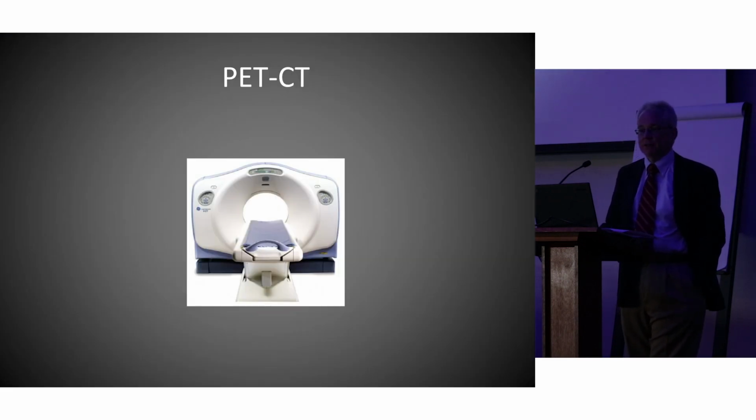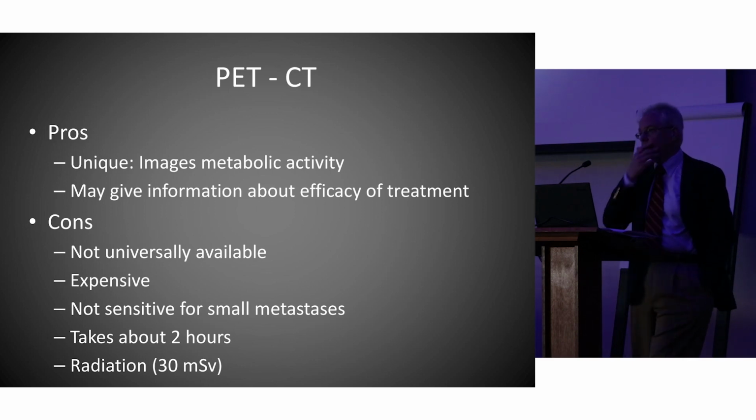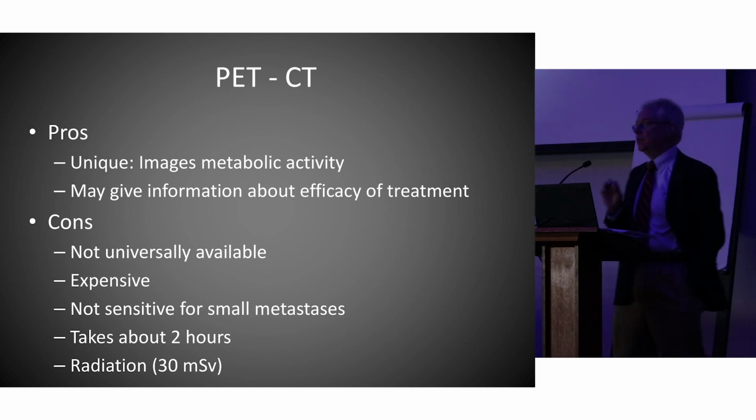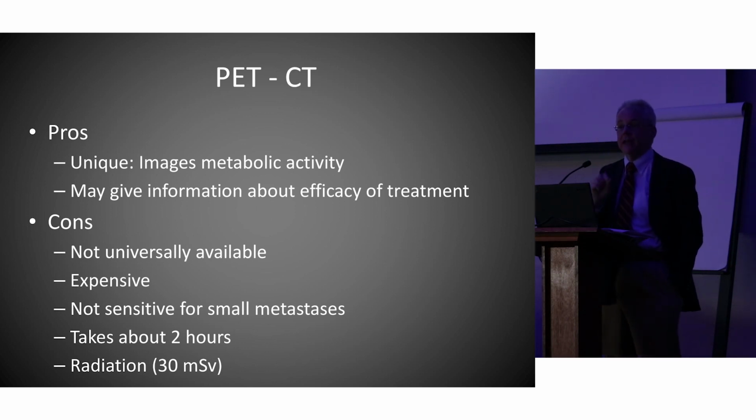This is what a PET CT looks like. A PET scan is not so much assessing the structure, seeing tumors as nodules and that sort of thing. It's assessing the metabolic activity, how the tumor is growing and living.